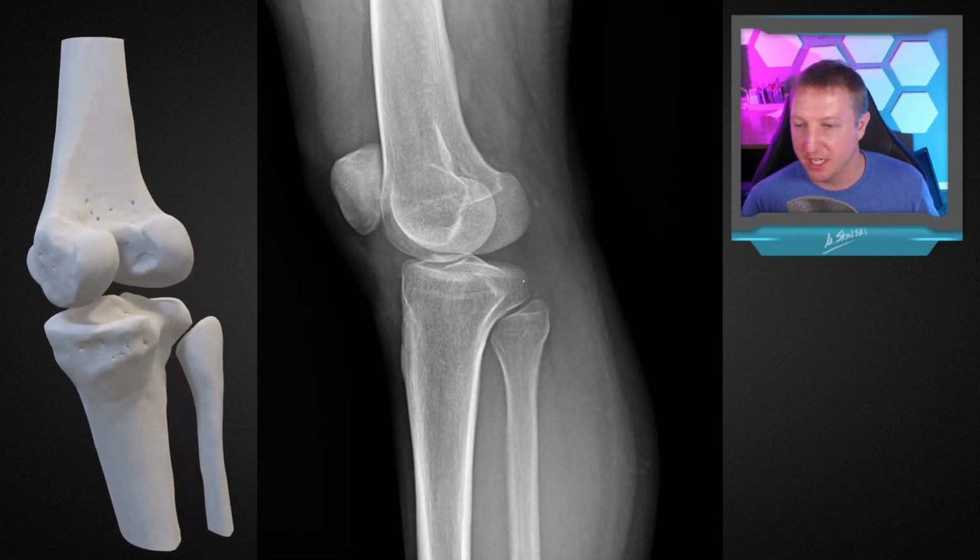All right, and that's the case in this image. I forgot I added this one. And so look at how nice we can see the proximal tibiofibular joint here. And so we know that this is going to be our lateral femoral condyle projecting back here. And oh, look at that. We got the beginning of the formation of a little os fabella, depositing a little sesamoid, the posterior patella, if you will, to help that mechanical transition of force around the corner here, just like our patella does around the corner of the knee when we're flexing and extending.